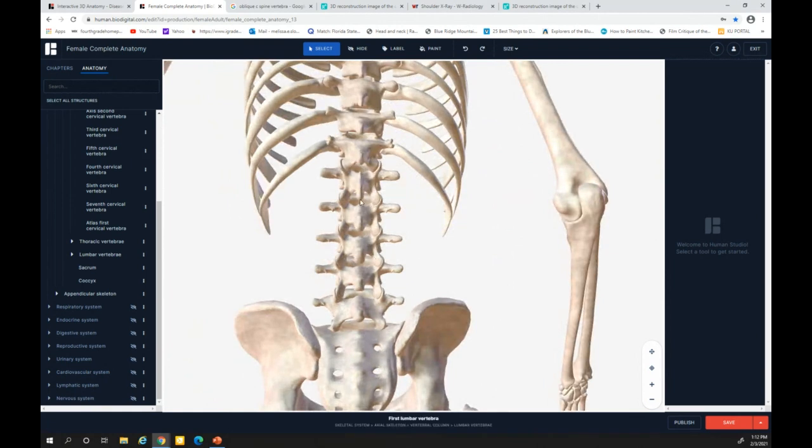All right, so here we're seeing the spinous process. These are the transverse processes. You're going to watch this one turn into the nose, the dog's nose. This is our patient's left side, because we're looking at their back. So the side with the arm is their right side.